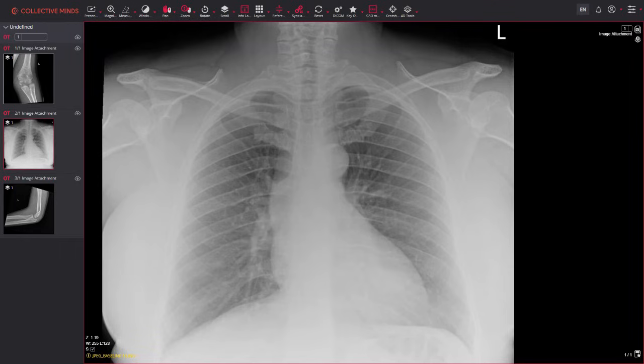So if the patient's had a mastectomy, you can see here you've got this faint opacity over the lower zones, and that's because we've got breast tissue overlying it. If the patient's had a mastectomy, one side will look darker than the other. And if you don't spot it, then you could interpret that as some pathology, like infection, for instance. So always check if it's a female, have they had any breast surgery, mastectomy, resection. Sometimes we'll have surgical clips at the axilla, which is a bit of a clue.